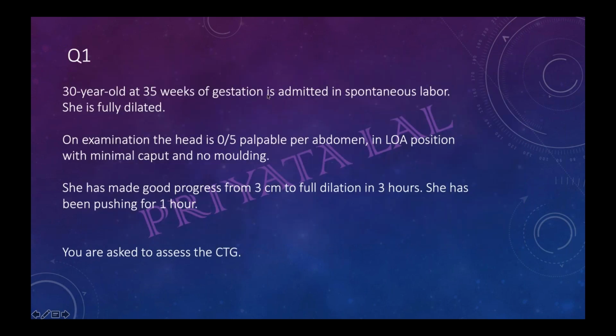Okay, but this question makes no sense because I will not ask management. I will ask interpretation of the scan. Just see that as well. Not an issue.